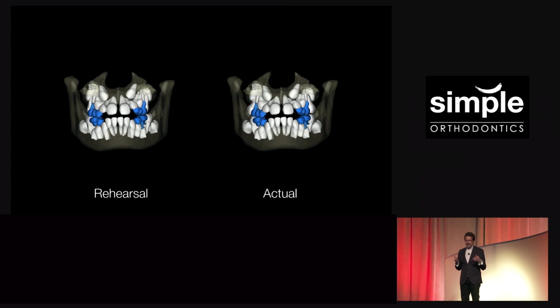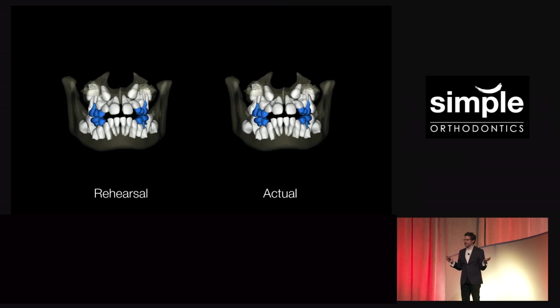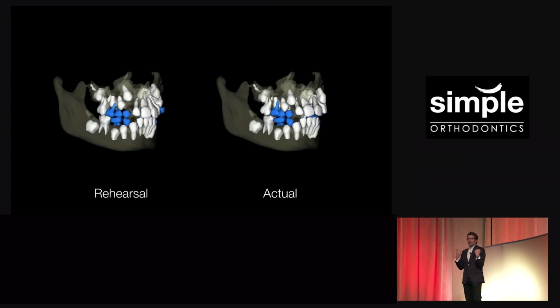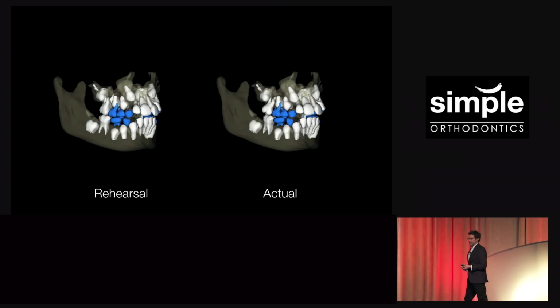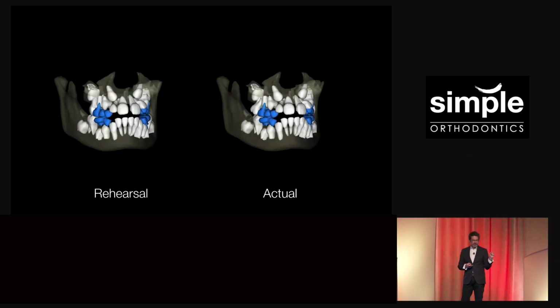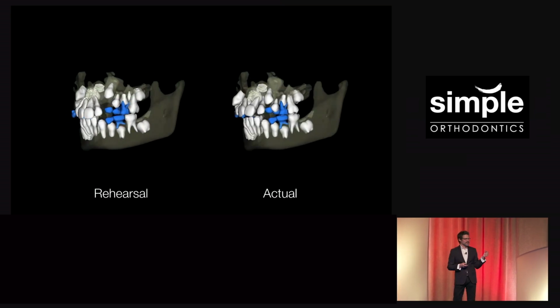But notice how the incisors responded. There were no appliances on the maxillary incisors at all. Look at the buccal root tip on the lateral incisors as we expand, particularly that left one. Look at how much that root flies forward. We didn't even touch that tooth.